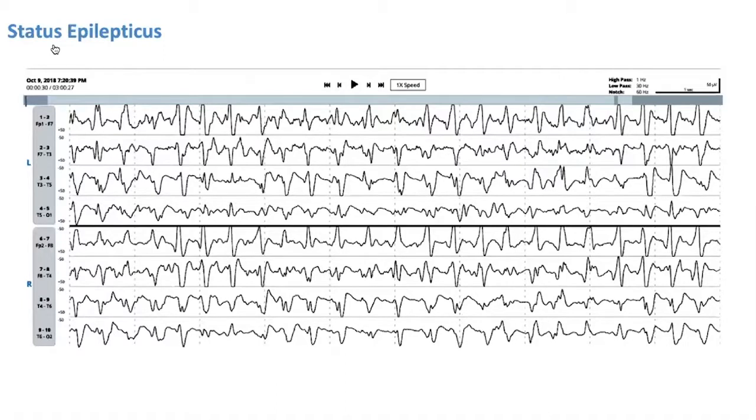So also to differentiate between this pattern and GPDs or GPADs, John, would you agree that in this case, of course, we are not seeing the preceding phases? There was clearly an evolution of waveforms that brought us to this page that we are showing. But just by looking at this page, of course, some EEGers are well known to have inter-rater variability, very significant ones. So one person may call this GPADs and another person may call it status.